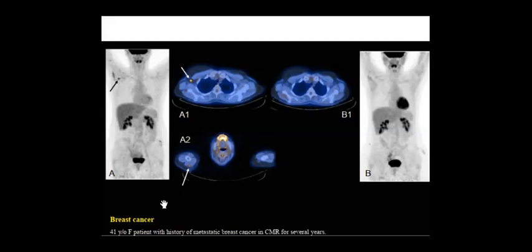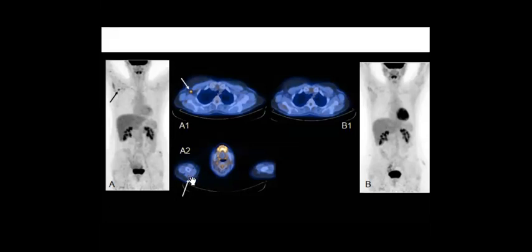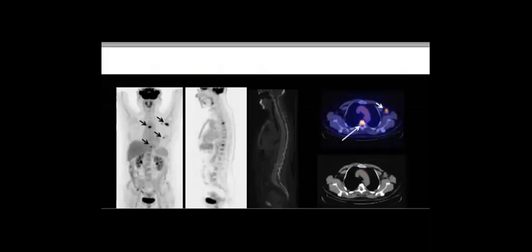So take care about it, because they like in the exam to show you something very simple in the PET-CT, that this one could be site of injection, and it is. He took this recent vaccination in the right deltoid region. So this is the patient's injection site. Sometimes it's very simple to ask you a question and the answer will be again very simple.